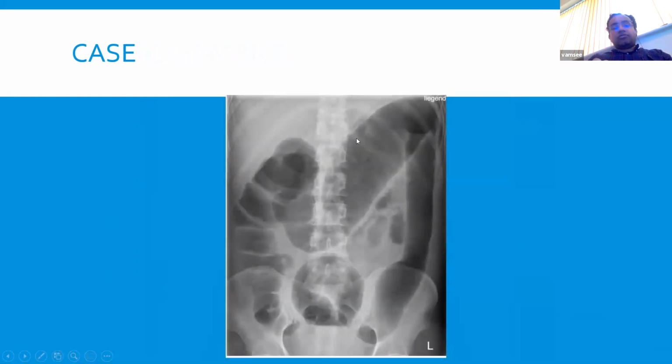This is another case of large bowel obstruction, a specific case of toxic colon. What gives it away is you've got lead piping on the left-hand side, which is where you've got complete loss of haustral folds and enlargement. This is a medical emergency.